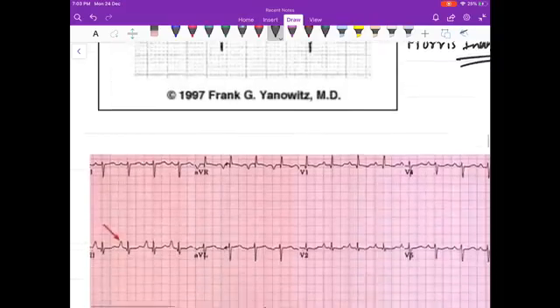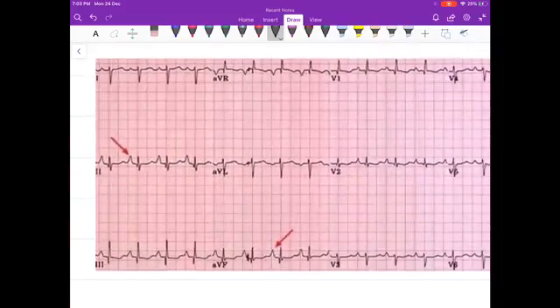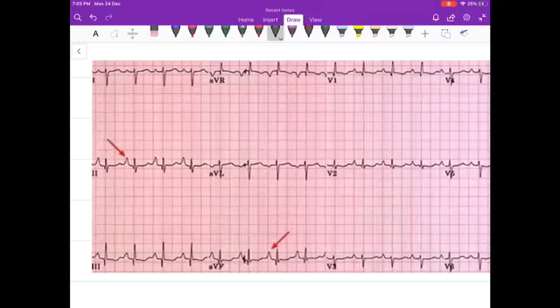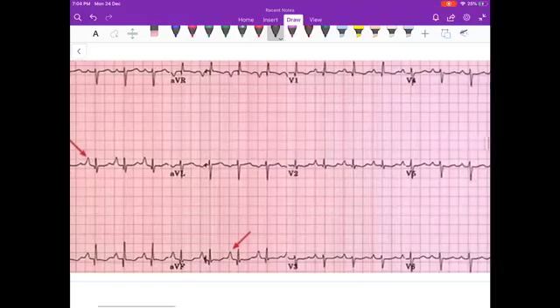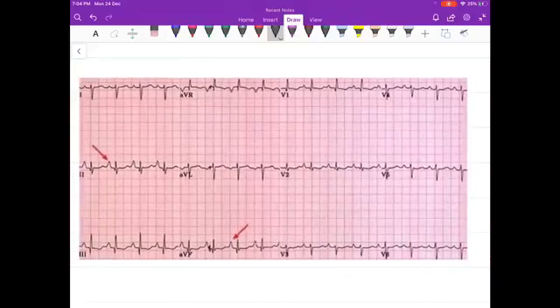So moving on to the next ECG. What do you see friends here? You can pause the video, and I will begin on to the solutions. So this is the complete ECG. The arrow is pointing here, it is pointing on to the P wave.